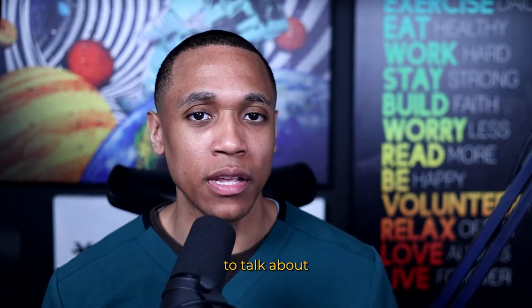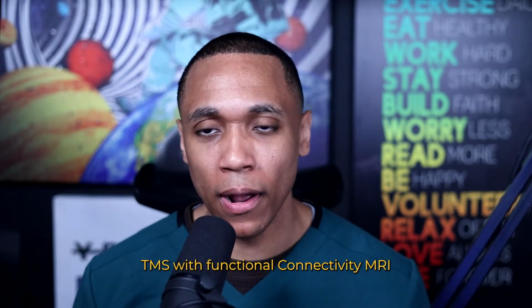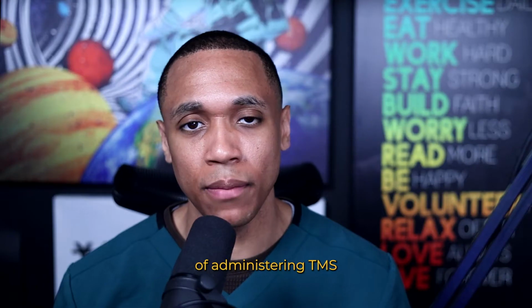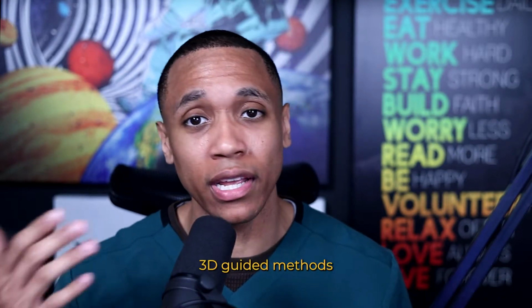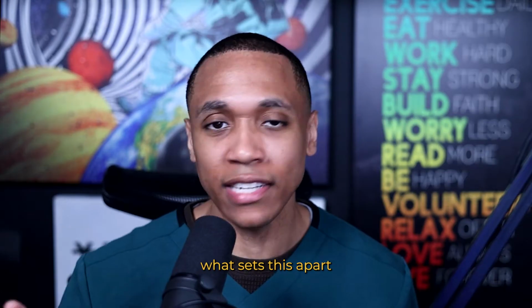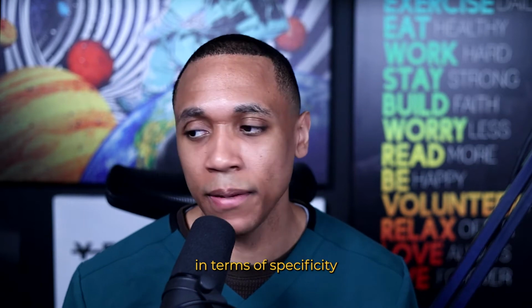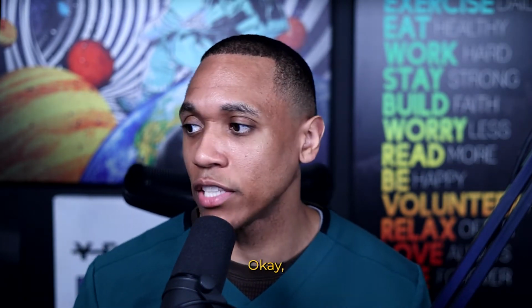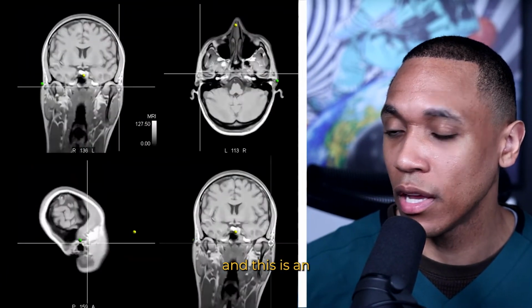As mentioned, we're going to talk about TMS with functional connectivity MRI, which is different from the traditional methods of administering TMS and different from, say, 3D guided methods of administering TMS. I'm just going to go over what sets this apart in terms of specificity and customization of the brain and finding the treatment location.